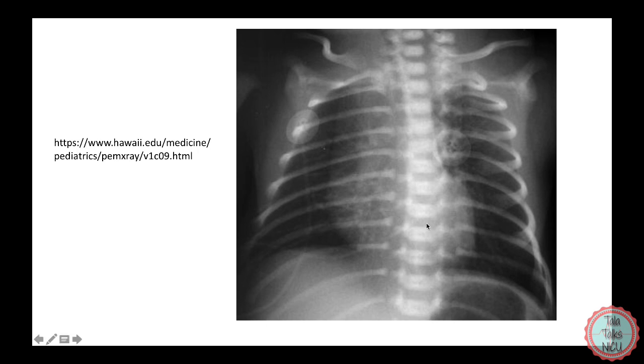As you all know, the heart is also on the left side, and the majority of the heart is on the left side in x-rays. But on this x-ray, it looks like the majority of it is on the right side. Again, also consistent with the fact that this is a rotated picture. In this case, you can't really say a lot about the heart border.